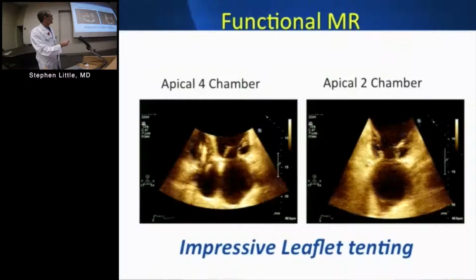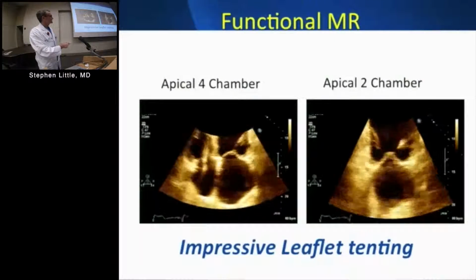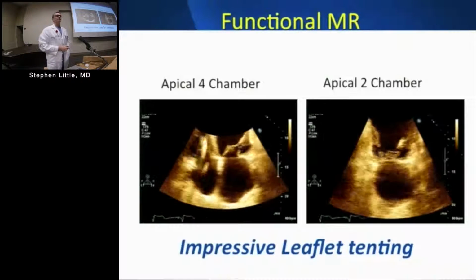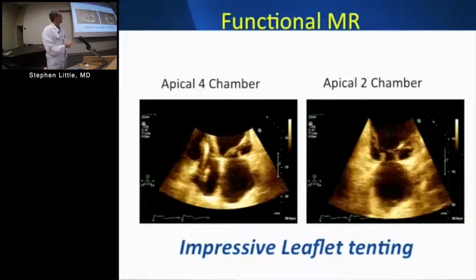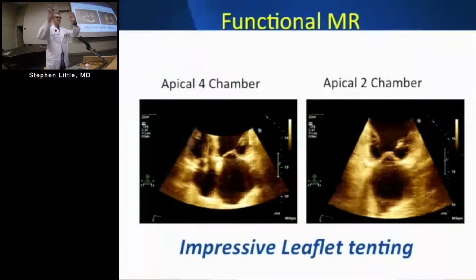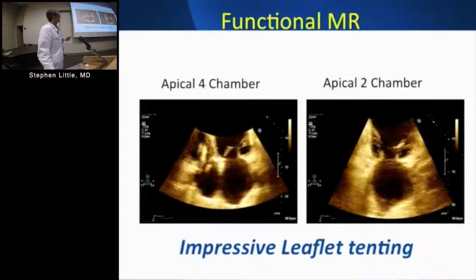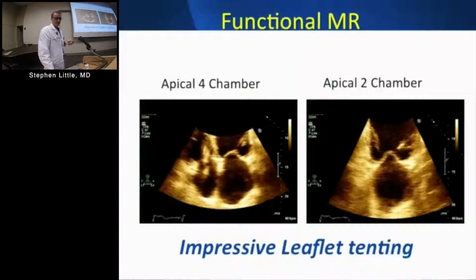And top one. There you go. If you measure a straight line across the annulus and measure to the leaflet, it's a very clear tenting area. So if you can clearly define a tenting area, and there have been studies using 3D echo that have shown the greater the tenting area, the greater the severity of the MR. So that's one metric of saying, yeah, this has got a very, very tiny coaptation zone. The leaflets are just touching at their tips instead of along a long coaptation zone. So not only is there a mechanism defined clearly, but probably the MR is going to be significant when you see the leaflets barely touching like that.